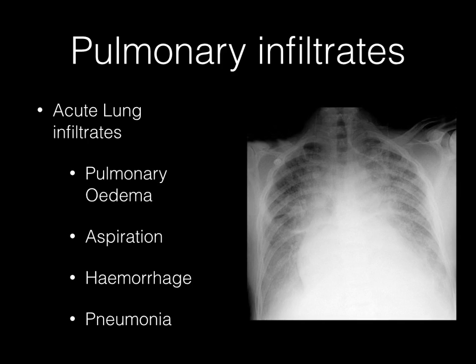Pulmonary edema will classically present with bilateral pulmonary infiltrates, which are symmetrical in nature. It may sometimes give what is called a bat wing appearance. We'll talk about that in a few minutes. There is also an increase in the bronchovascular markings, and there will be upper lobe diversion, and you may be able to visualize that the heart shadow looks particularly large, which means there's cardiomegaly.